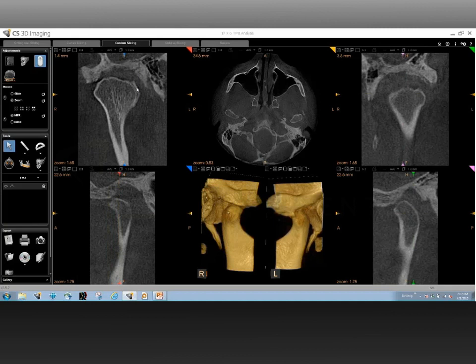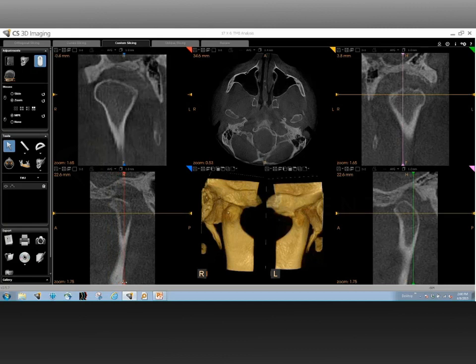You also see some sort of remodeling that's happening on the medial pole, which again indicates osteoarthritic changes. In fact, it's not really smooth and rounded, as I had mentioned earlier. There's a little bit of corrugated kind of appearance, maybe a little bit of break in the cortical areas right there I'm pointing to, again indicating degenerative disease or bone remodeling.